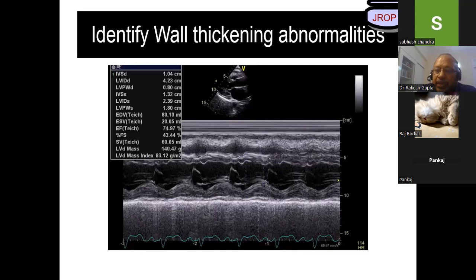Dr. Swapnil Datta, are you there? Yes, sir. Sir, it can be a dyskinesia. No. Then we can consider anterior wall MI for this. Everybody's answer is wrong. Anybody would like to try this question?